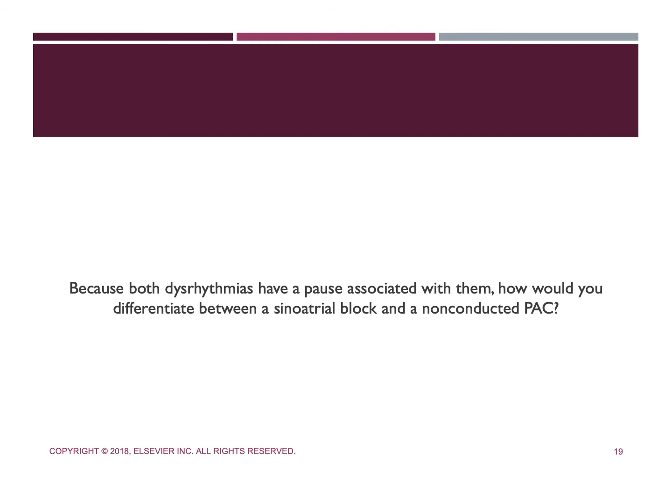Now, in sinoatrial block, an entire PQRST cycle is missing, and there is no distortion whatsoever of the T wave preceding that pause.